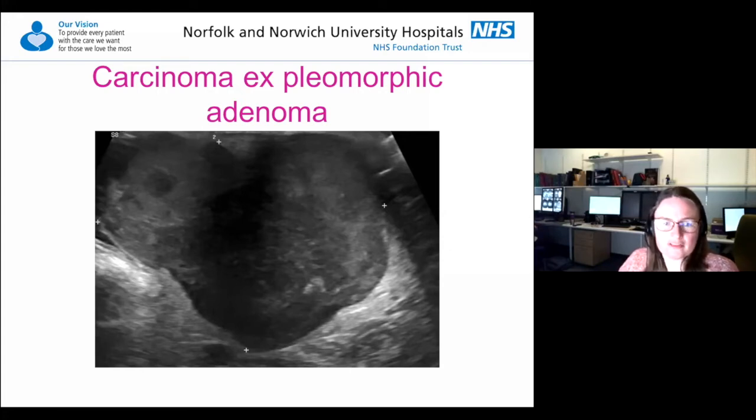So the history is obviously very helpful here, knowing that it was a pre-existing mass that had rapidly grown. I don't think you know that for sure by looking at it, but you could definitely be concerned it was an aggressive lesion, given the history.